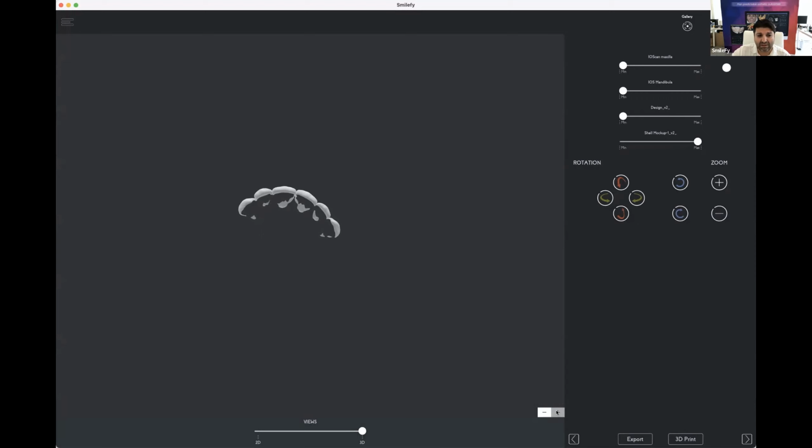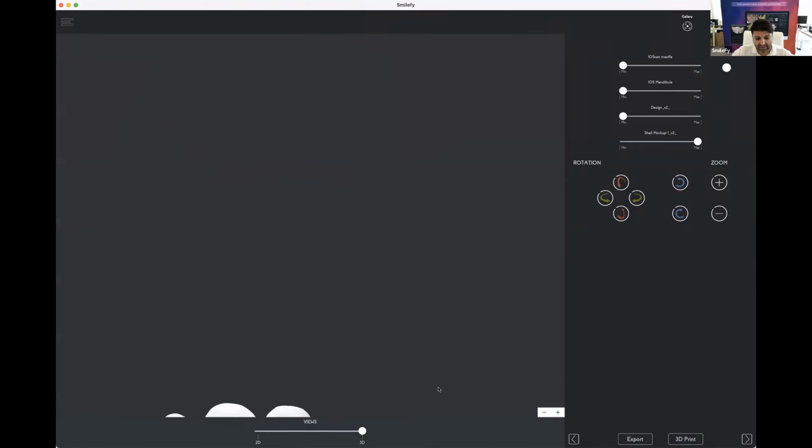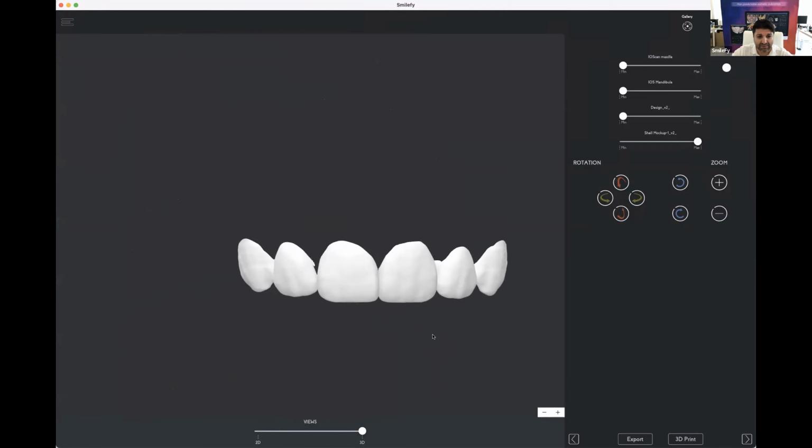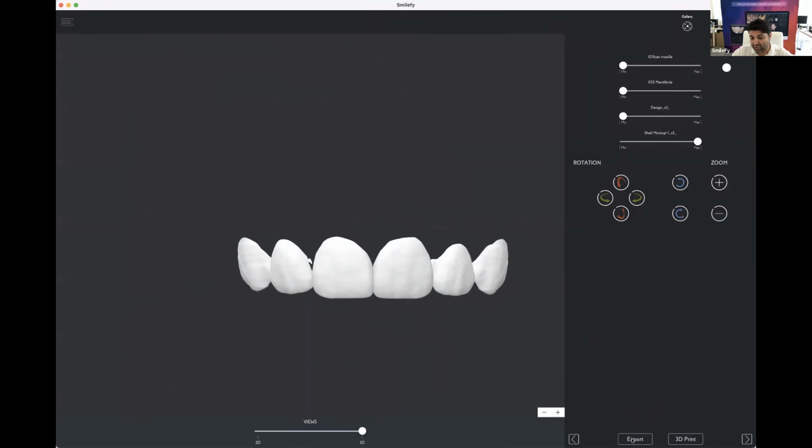But nevertheless, you can export and print. Now you have two options here. I need to increase the speed of this zoom because I'm gonna get old until the zoom is increasing here. So these are the shells, right? I do have export and print, so I can export all the files from that case, and I get everything in a folder. I get the pictures, I get the design, the teeth, the CBCT, everything is superimposed and calibrated when you want to use a different software, but the mockups, the shell mockup, everything is in a structure.